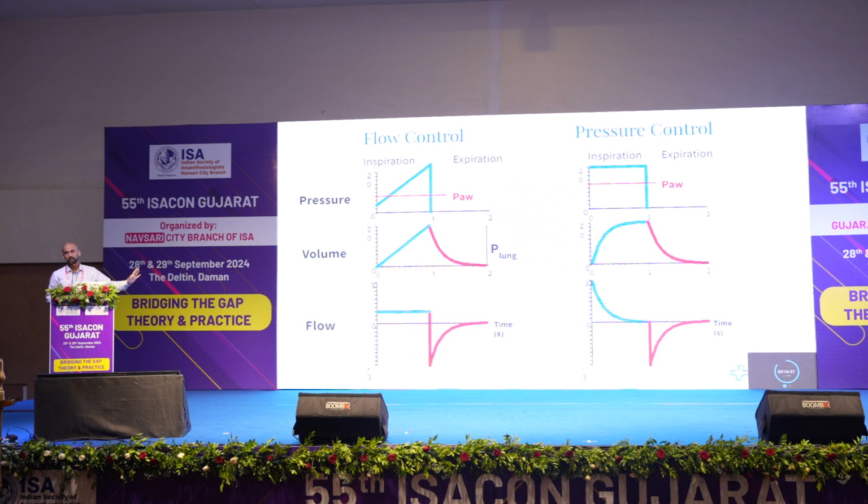Be very clear that the terms pressure control and flow control are distinct and based on the flow-time and pressure-time scalar. The scalar to look for is the one that has a geometric shape. I'll repeat this throughout the talk so that you develop a sense of practice in how we classify modes. Remember, I'm using generic terms and not company-derived trade names.